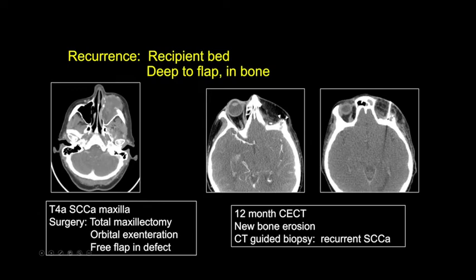Now, this patient had another huge tumor in the maxilla, maxillary sinus, had an orbital exenteration. To fill in the empty socket, they put a muscular flap back here, and the anterior portion of the flap was fatty. And look what we have right here. The residual bone right at the interface of the flap is destroyed. There's a soft tissue component and destruction of this bone.